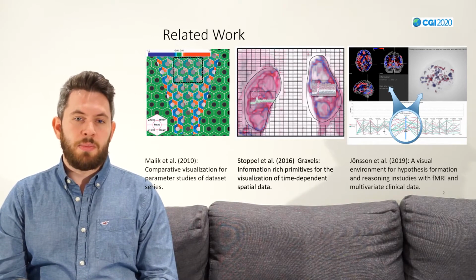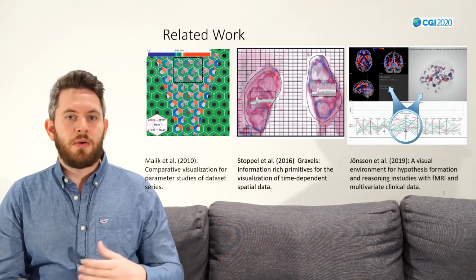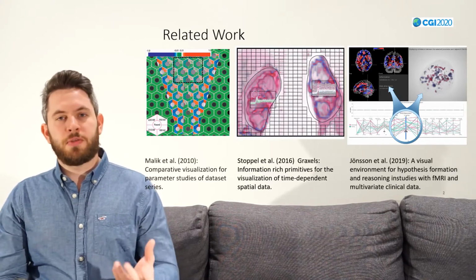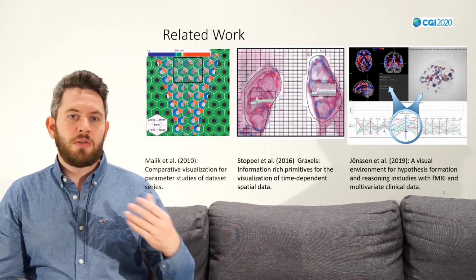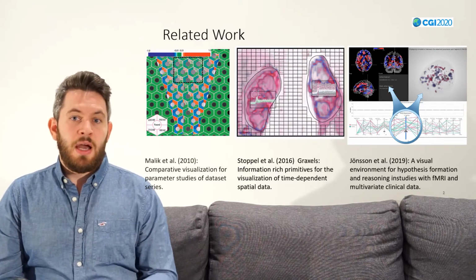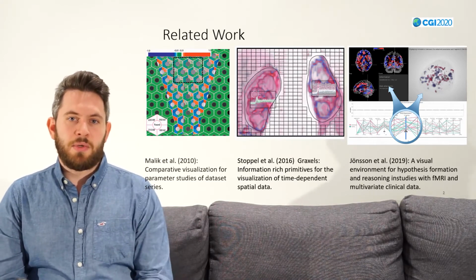So why does our application differ now? In our application we show spatial data in an abstract form on top of spatial data, for example. We also provide probing interaction in a 3-dimensional space, and we also visualize a similarity visualization.